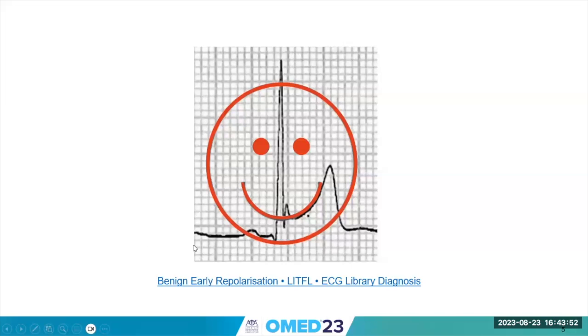Here's the end of our T wave coming into the beginning of our P, so the TP segment, this is our baseline. But the difference between benign early repolarization and STEMI is, number one, we talked about reciprocal changes, right? Benign early repolarization will have diffuse ST elevation, but there will not be any reciprocal changes because there's not that actual damage being caused to the tissue, which is causing the electrical current conduction issues, right?